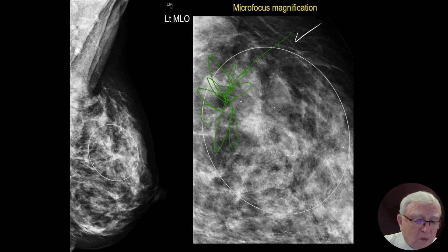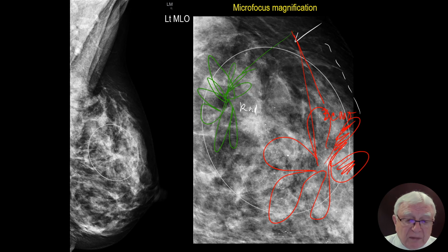What is the second one? Could this be a radial scar? It could be. And because it's close to the surface and it's not palpable, I'd say, I got a point supporting the radial scar. Otherwise, watch out. Is this a BCMO, a cancer of mesenchymal origin? Is this DAB? No, I don't think so.